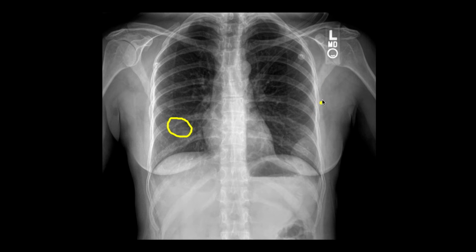On this side, as we get down to here, you can see that this margin of the rib is lost. And so this patient has an expansile lesion of the rib as a result of the lung cancer, and it's forming a large pleural-based mass there. So lung cancer with a metastasis in the anterior end of one of the ribs with a large pleural-based mass in this example.